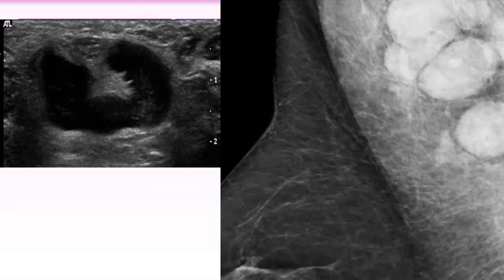By mammography, the outlines of the capsule of the lymph nodes also show an indistinct wall with some undulations and irregularity, lobulations, and inhomogeneous cortex. So yes, suspicion for pathology.